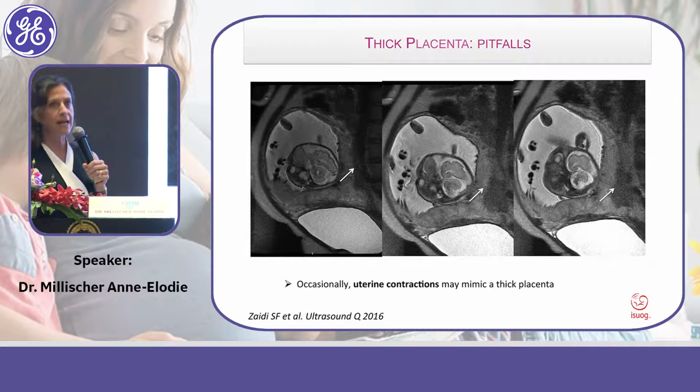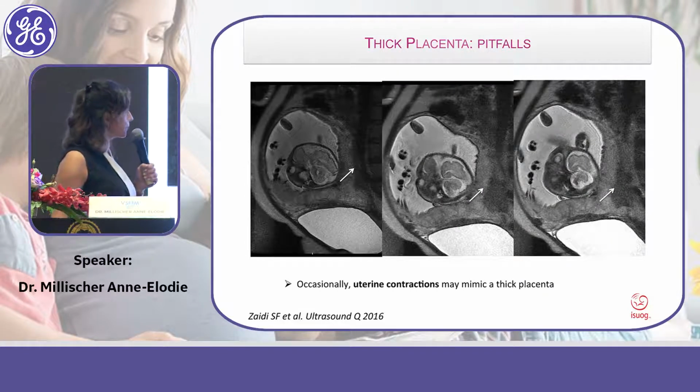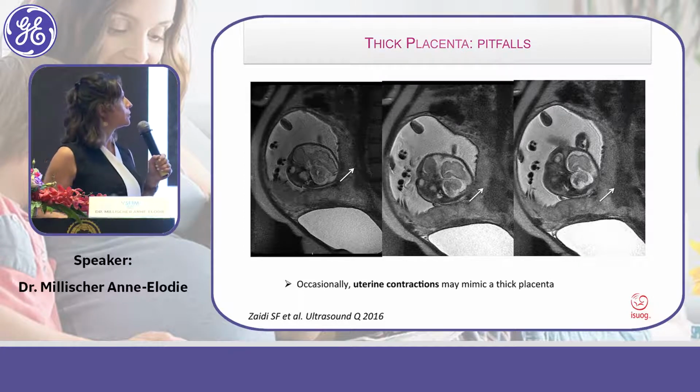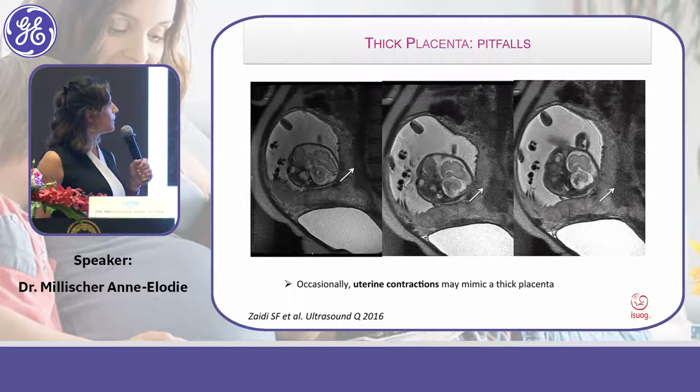With MRI, sometimes we can misdiagnose a fake thick placenta, which is just due to a contraction, as you can see on this picture.